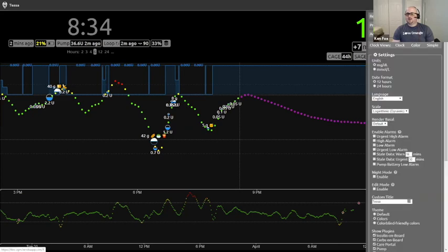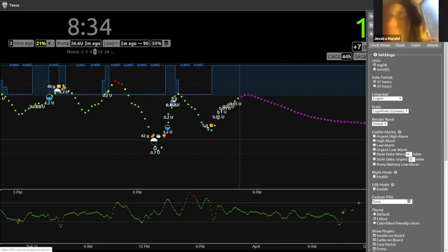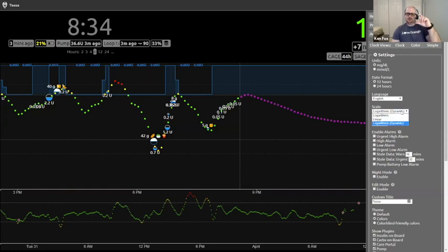Okay. So in this menu, the 3 lines at the top, this is where you get to most of the other stuff. So you can see you have options. You can access reports, your profile editor, which is actually your pump settings, admin tools, some clocks, which people always look over. And then you have some settings down here too we'll go through. So again, it's covered in Loop Docs, but you can change what units it's using, date format, and how you want the numbers and the graph to look.